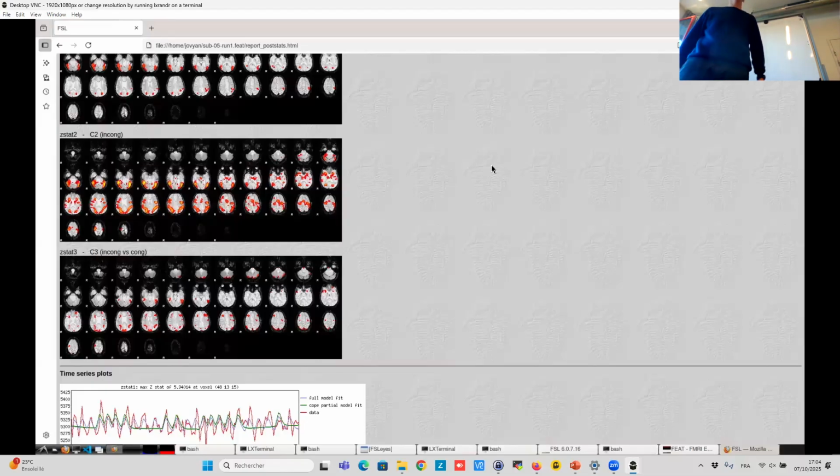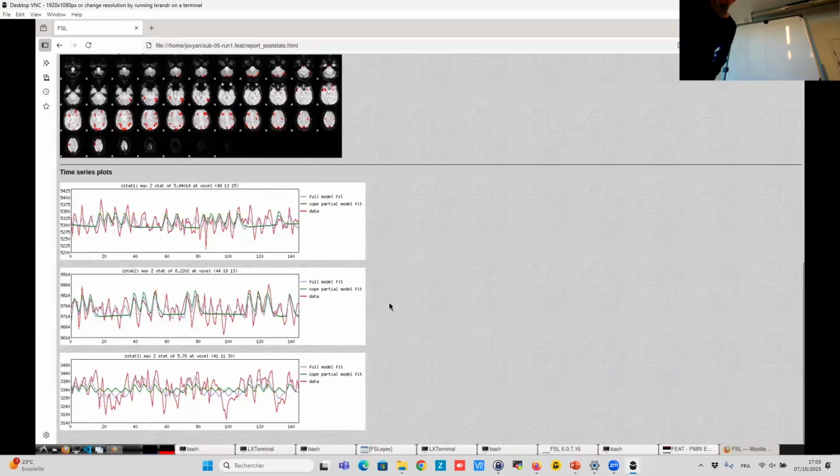Nothing is happening in which subject? Subject one. I don't have anything. So this is the limitation. We are at the individual level, but it's a first level. You can get signal, for example, for this parameter, but to get something from it you need to go to a group level. If it was too easy, it would be only one subject. So that is interesting.